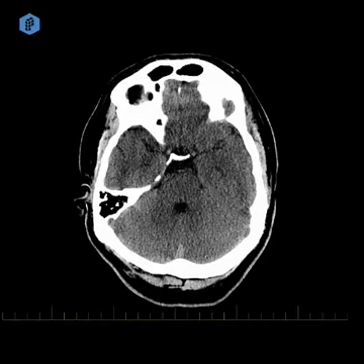I'd like to share how I interpret a CT brain. I believe interpretation of a radiology study needs to follow a set of steps to ensure accuracy. So I usually start with the axial set of images in the brain window.